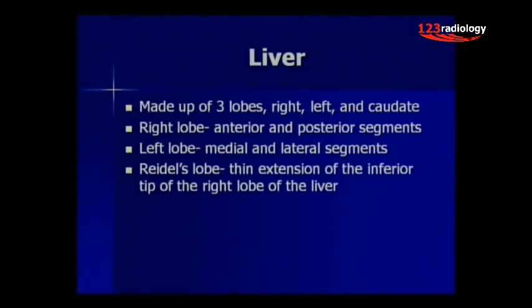Now, Riedel's lobe, which our prior speaker talked about, is not really a lobe of the liver at all, but rather a thin extension of the inferior tip of the right lobe of the liver. And this is more typically seen in thin women.